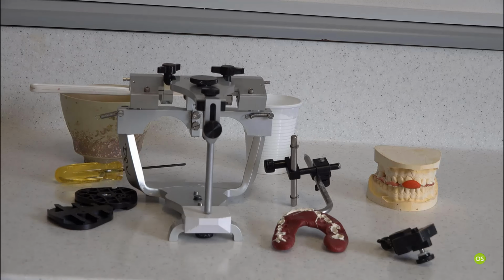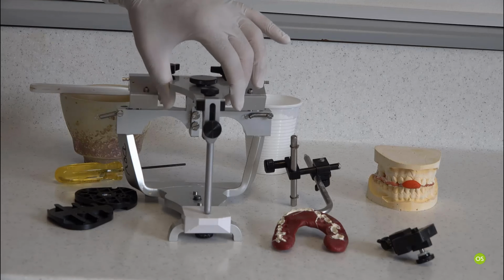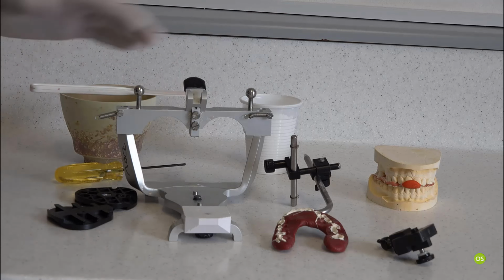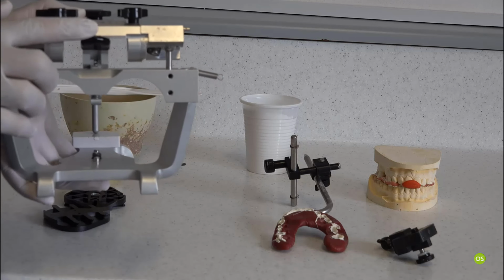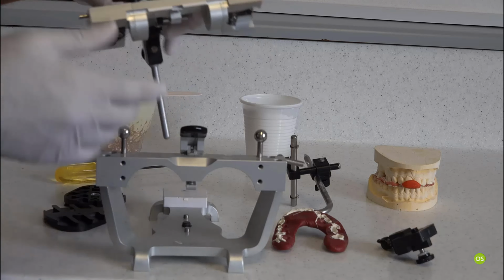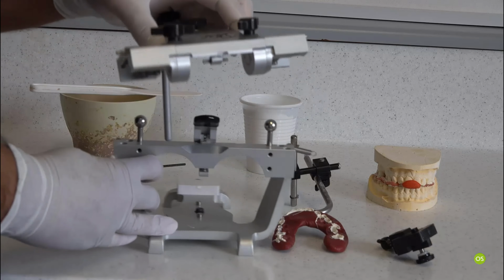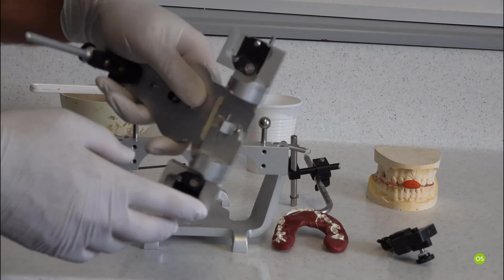Now, Denar is not the only articulator you can use. There are other articulators, there are very fancy articulators available. However, this is what I use, and this is what I'm going to go through with you today. So first of all, for mounting, what you need to do is you need to remove the top bit of the articulator by using this clip here. So you click and that comes up, and then you would take the top bit out. When you take that out, you will be able to see the condyle inclination here, which I've kept to 25.